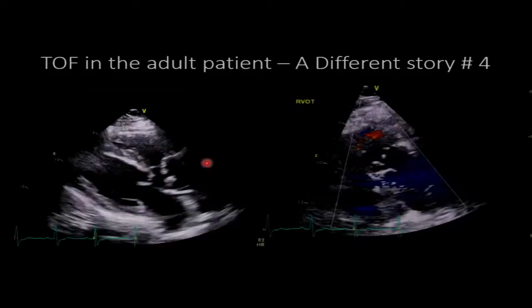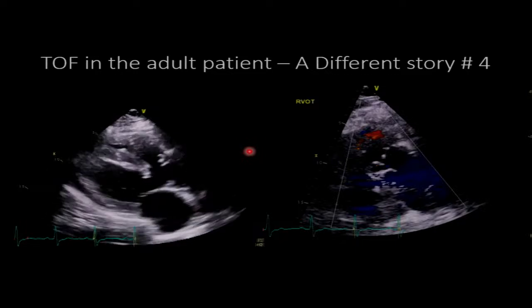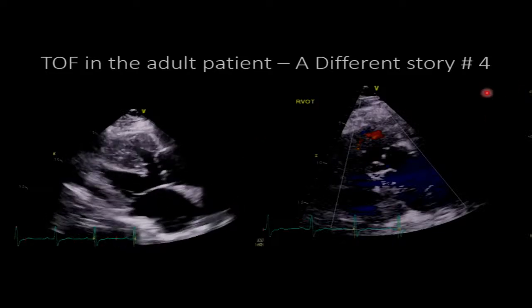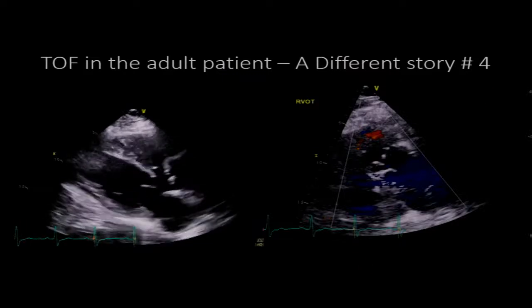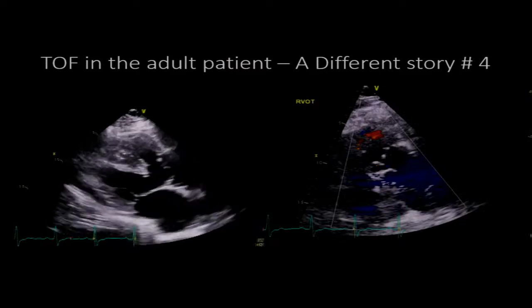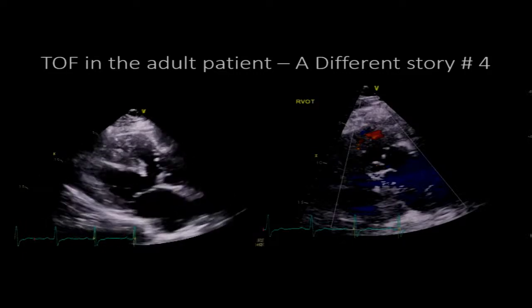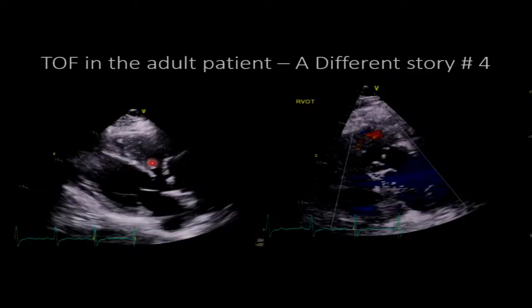All right, so let me show you this. This is a 39-year-old patient who comes to your echo lab, and you get this parasternal long axis view. Is this patient similar to the ones that we just reviewed, cases 1, 2, and 3? No. What's the difference? That's right, where there was a patch that is supposed to be here.